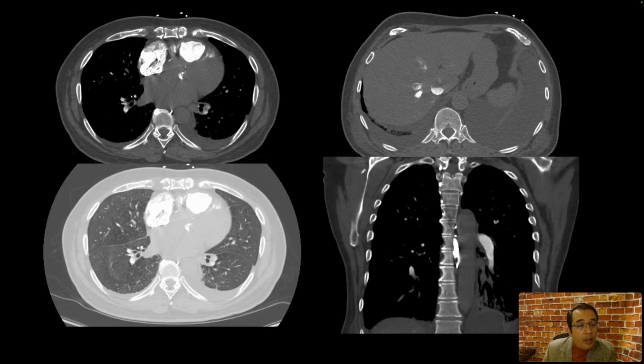This next patient underwent a CT of the chest, a CTPE protocol, and the interesting finding here is that if you look at the coronal image, there are filling defects seen in the left and right pulmonary artery branches in a symmetric fashion, where they are not punched out defects which the clots show up as, but there is gradual dilution in the concentration of the contrast as we go from the proximal to the distal part of the vessel. And this finding is suggesting that this is an artifact, not actual PE.